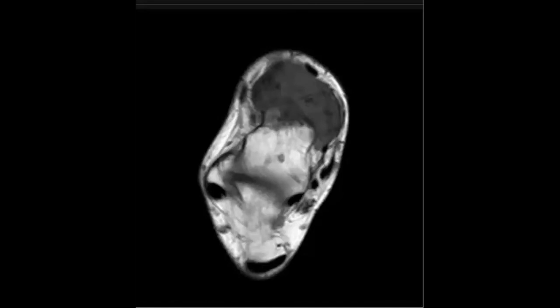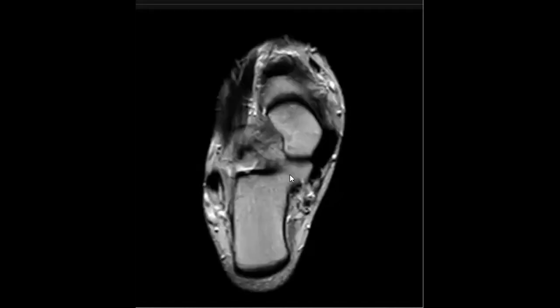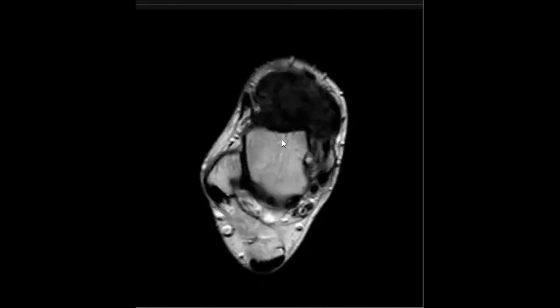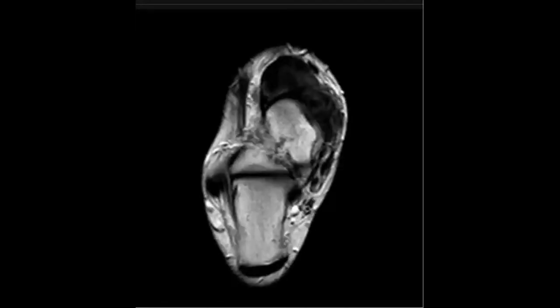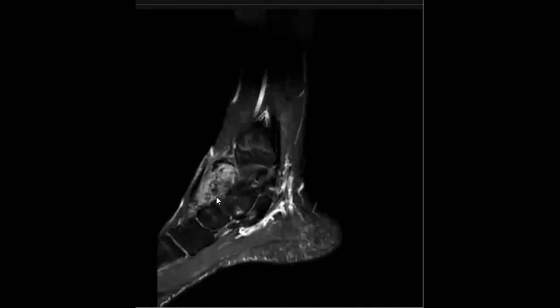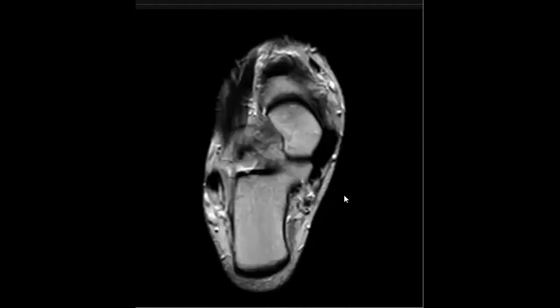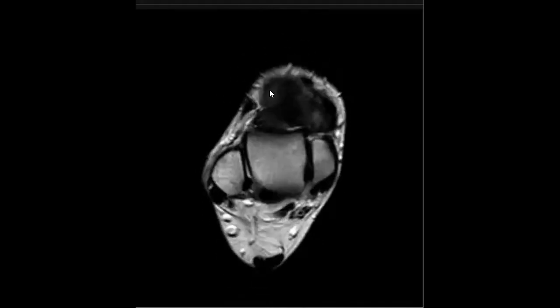T2, yes, T2, and especially gradient T2. In the gradient T2 or T2, you see this appearance. So what do you think after you saw it? As you see, the STIR will not show much difference, but the T2 will be the main difference. What do you think? Yes, there is hemosiderin deposition.